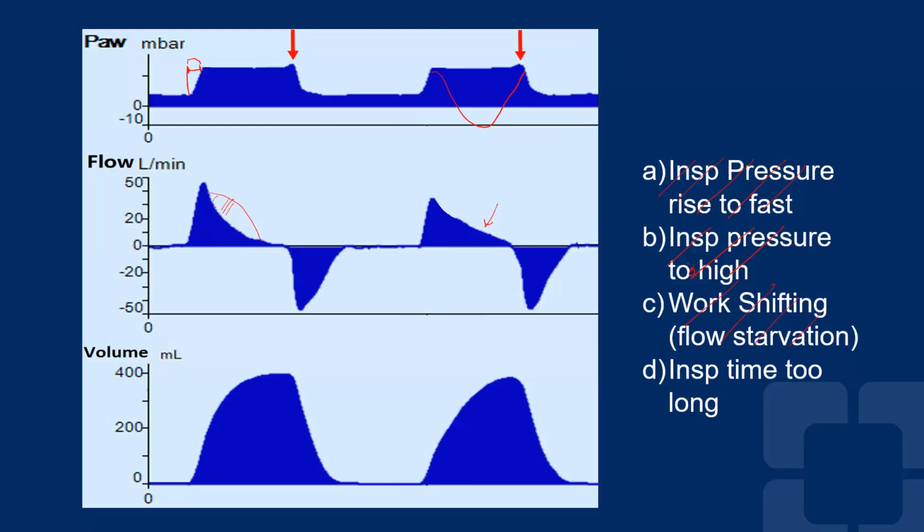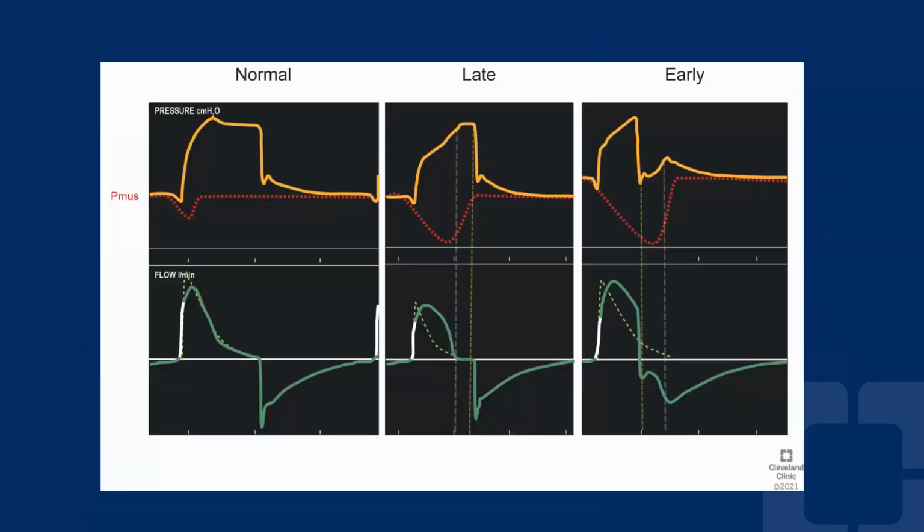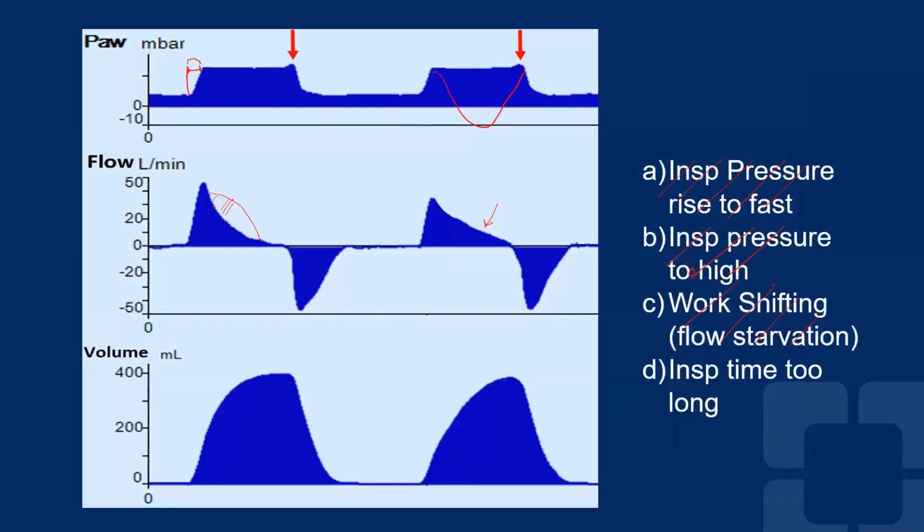Before we go to the answers, what you can see in the differences between the curves is that instead of the pressure decaying fast as it should, dropping down to PEEP immediately, it has this delay in reaching baseline, whereas the other one reached baseline rapidly. The other thing that changed is that the peak of the expiratory flow is blunted. There's less of a peak, and perhaps there's activation of the expiratory muscles, because we do not see the exponential decay that we would expect.